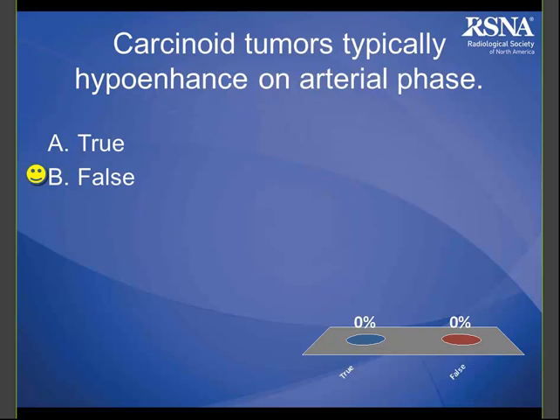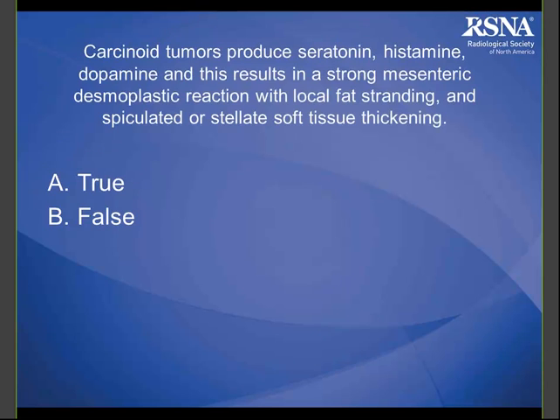But these patients we do biphasic liver protocol CTs, where we're doing the arterial phase through the entire liver, and that usually ends up scanning the pancreas as well. Usually the pancreas is included in that. And so we're looking to help us identify enhancing lesions in the liver for metastatic disease from a known neuroendocrine tumor.